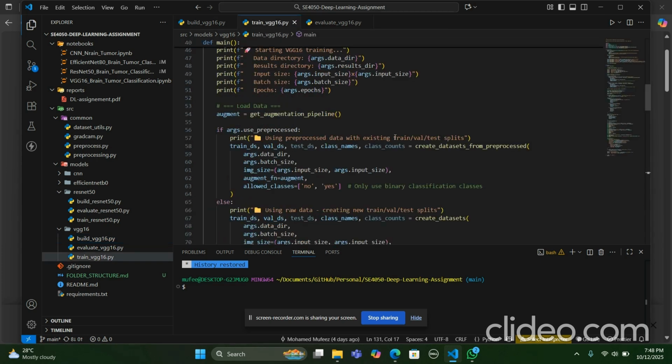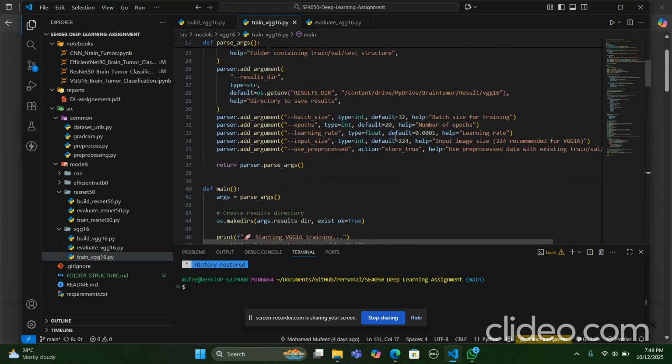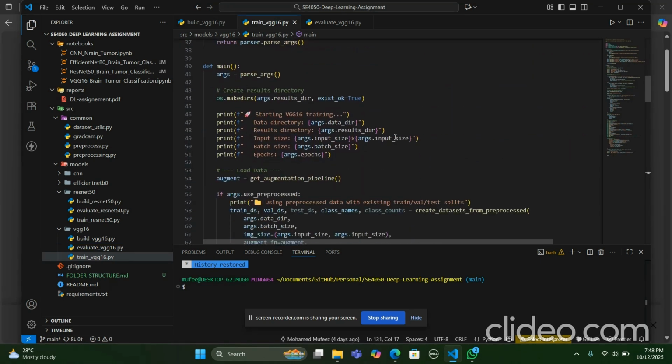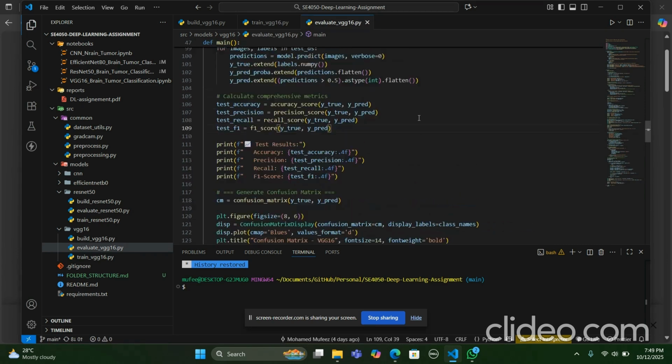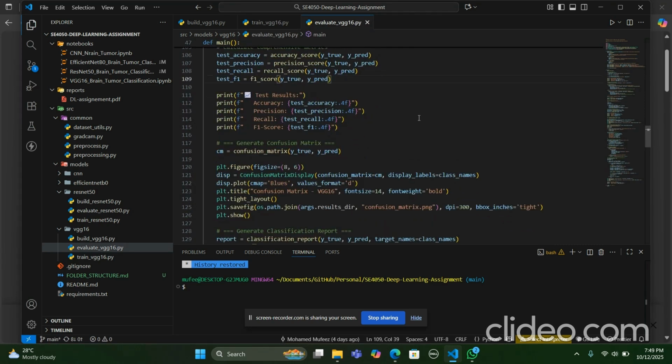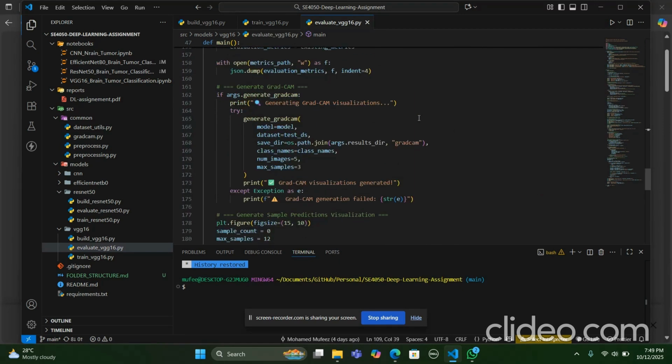And this is the class I have used for training the VGG16 for the brain tumor classification. It will show whether it's yes or no when we check for the brain tumor. Then this is the model to evaluate our trained model.